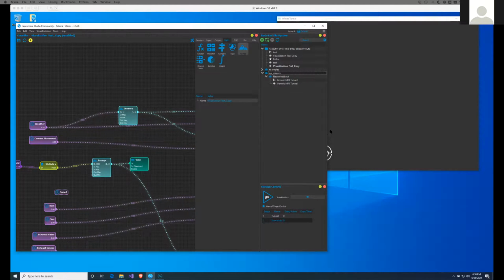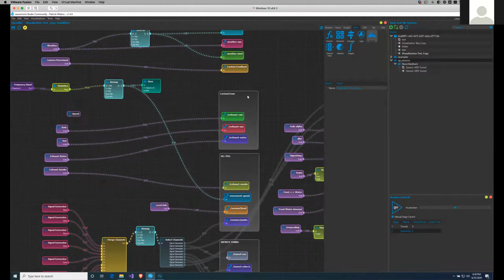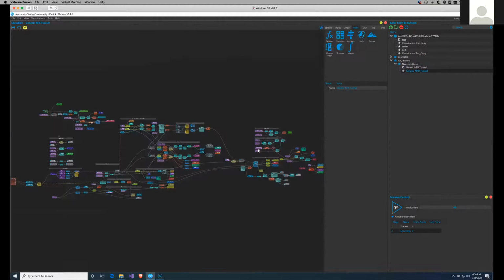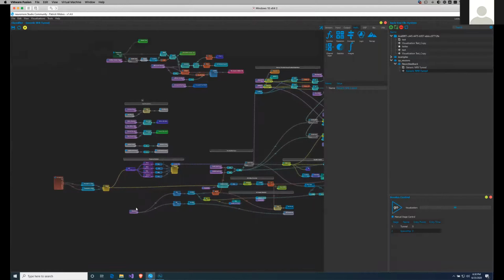So let's do the full screen studio, because first of all, we're going to look at the classifier and the state machine. So that's a 2-channel neurofeedback example. It's way more sophisticated than the ones that we have in the examples folder. It's not super sophisticated. It's also not medically validated, but it touches base on quite some of the functionalities and features of the neuromore studio in regards to neurofeedback in particular.